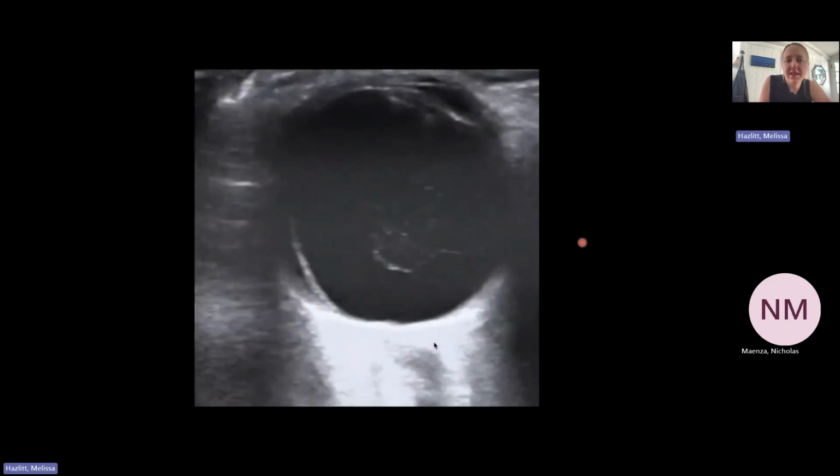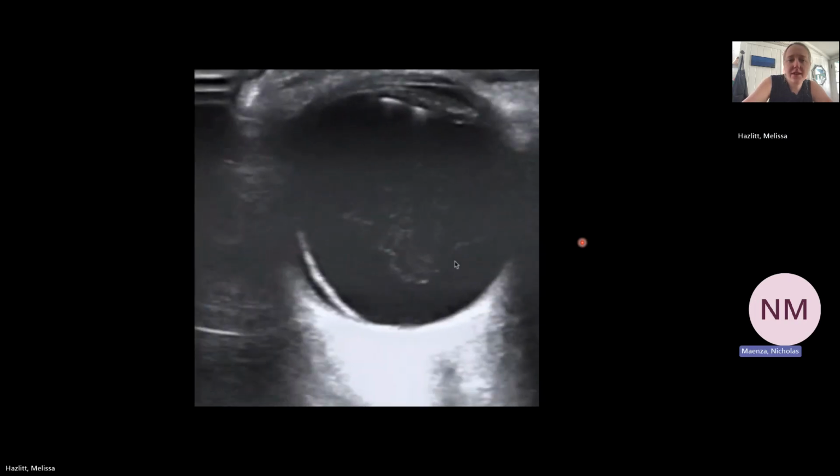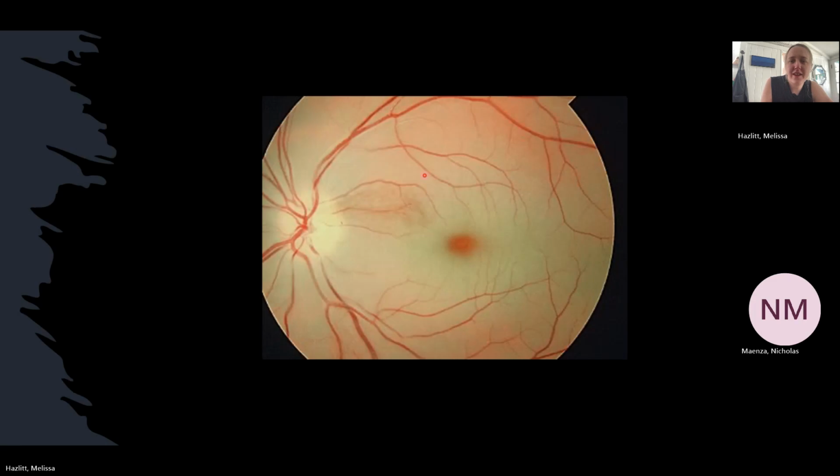And then what are we seeing in this particular image? Actually, I want to say trifecta, because it looks like you have a retinal detachment down there, vitreous detachment across, and then the hemorrhage right on top. Exactly. So that person's having a rough day. All right. This is just some more gratuitous torture.